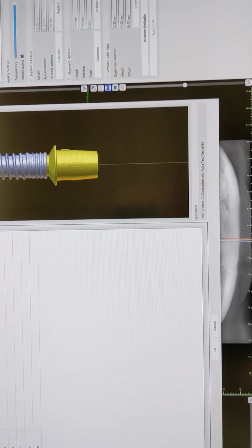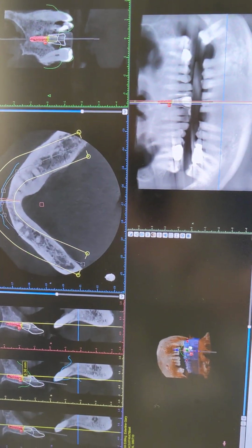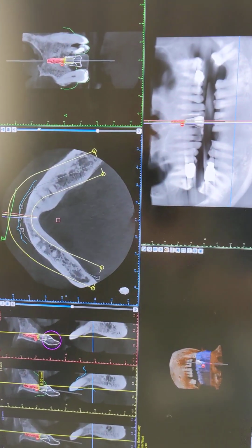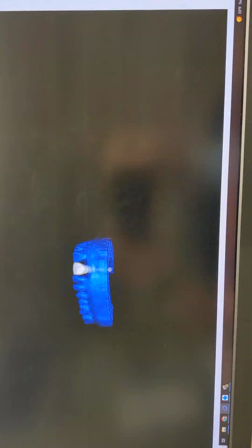Okay, so close that, and what I did is I resaved this as a second file. Okay, I saved it as a second Bluesky plan. Basically, I labeled it like temp generation. Okay, so then I go back to crown and bridge in the top corner. We open up here, and then you can go over here, and you can select crown on tie base.